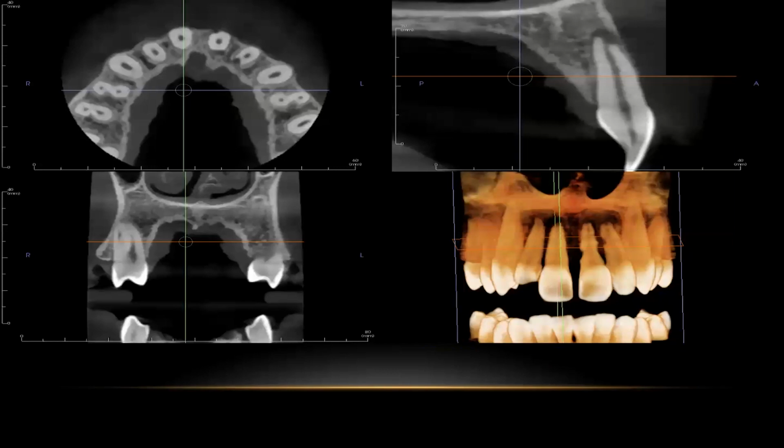Again, irrespective of the machine that you have in your office, irrespective of the software that you have in your office, all of you will get images like this with your CBCT scanner. Top left, this is an axial view, or a horizontal view. This view is the coronal view. This view is the sagittal view. We will look at these views a little bit more, but let's look at this axial view, top left corner.